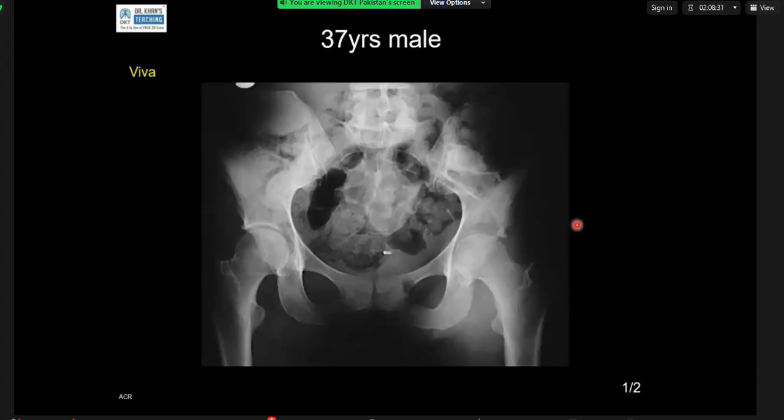There is also distension of the fatty planes, particularly the iliopsoas and the capsular. Also, I think the obturator is distended. So my first differential diagnosis would be septic arthritis. I would do ultrasound to confirm my findings.